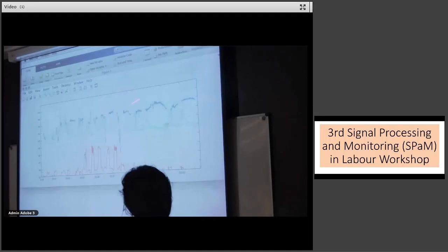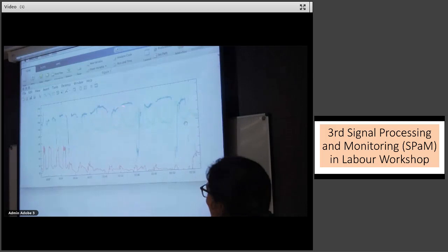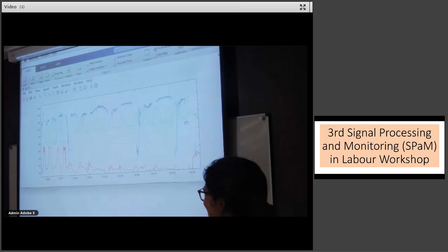Okay, so here we are. So after a very unstable baseline, we finally have a stable baseline. Okay, it's not just unstable. There are lots and lots of decelerations. Not a baseline, I agree with that. Not a baseline. Sorry, disagreement in the room. That's fine.